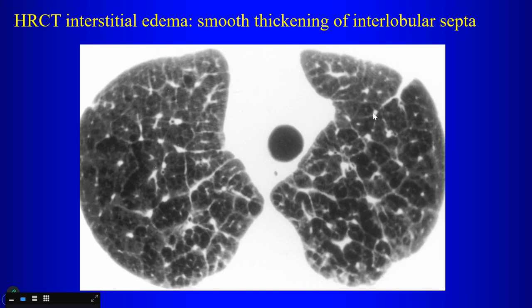These guys in the periphery, what are these guys? What are these guys in the periphery of the secondary pulmonary lobule? Interlobular pulmonary arteries? No, that's the point. You don't have pulmonary arteries along the interlobular septum. So those are what? Veins. Pulmonary veins, right? So pulmonary veins run in the periphery of the interlobular septae. The central lobular artery is found in the center of the secondary pulmonary lobule.